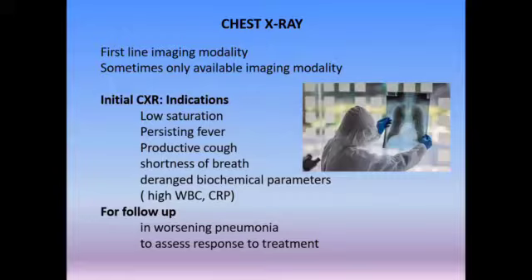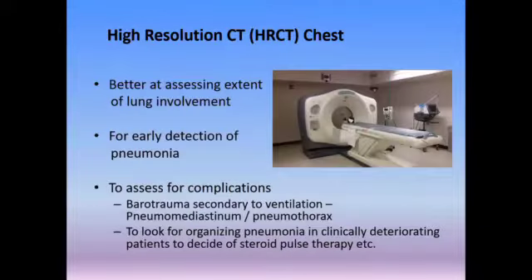And also, I haven't added here, but when the patient gets discharged, sometimes we call them back for follow-up X-rays to see whether their fibrosis or changes, pneumonia has settled. Then looking at the high-resolution CT study, this is actually better for assessing the extent and the degree of lung involvement, as you would all imagine.